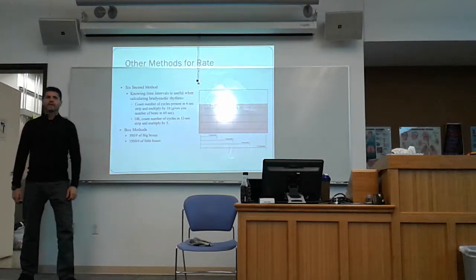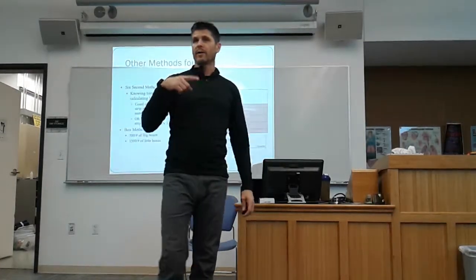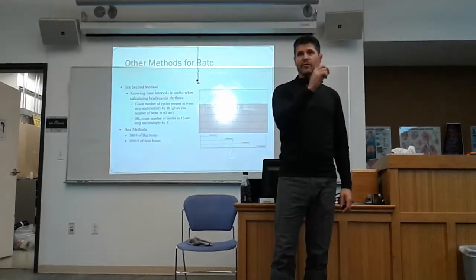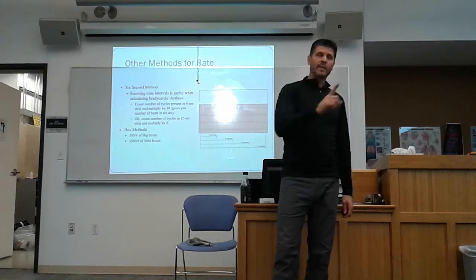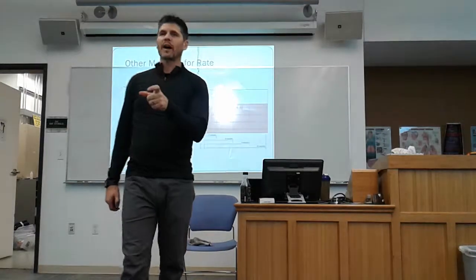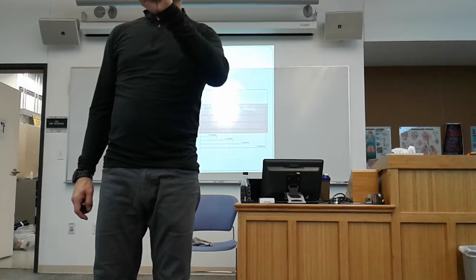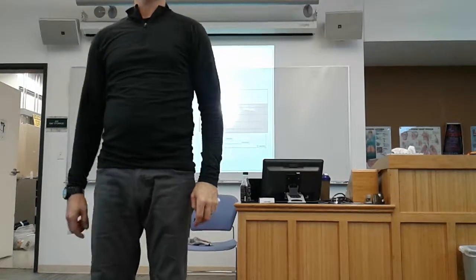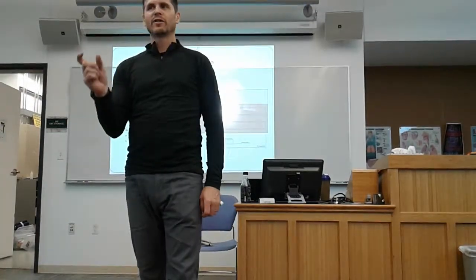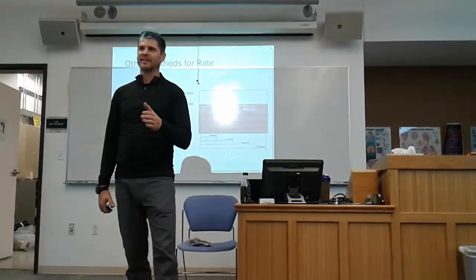Or you can do the actual math. The triplicate method that I just talked about, 300, 150, 100, 75, 60, 50, right? As you're going down, 43, 38, 33, 30. That method is based off the math. So, how many big boxes are there in 1 second? What's the time of a little box? 0.04. What's the time on a big box? 0.2. So how many are in 1 second? 5.